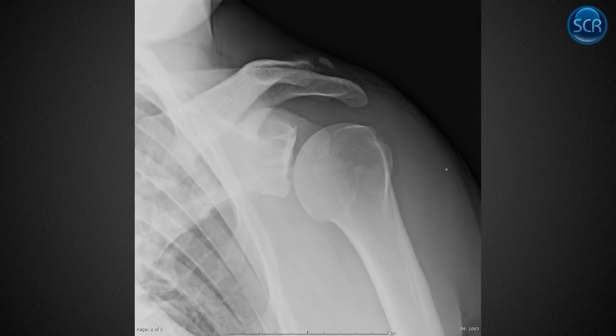What are we seeing in this case? The glenohumeral joint doesn't look too shabby. The humeral head looks normal, with the greater tuberosity here and the lesser coming, a kind of weird projection. The distal clavicle is abnormal. We follow this off and it just tapers off into nothing. This is osteolysis of the distal clavicle. They've got some little wisp of something here.